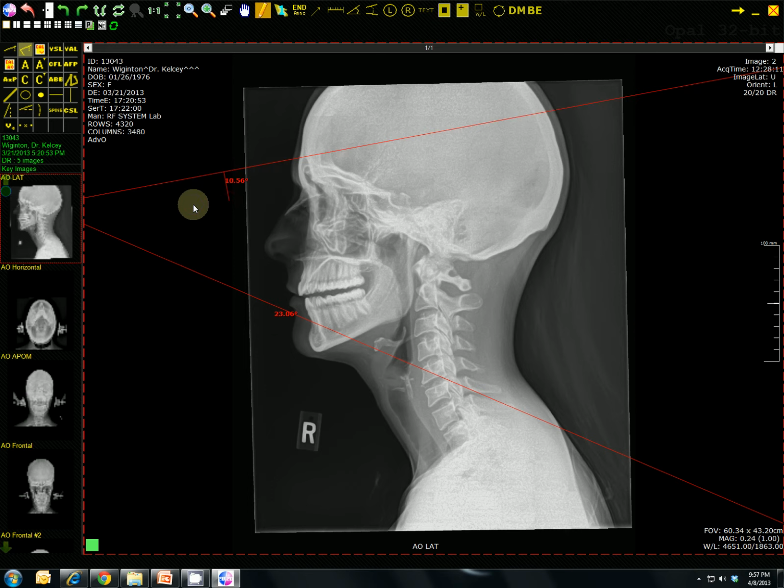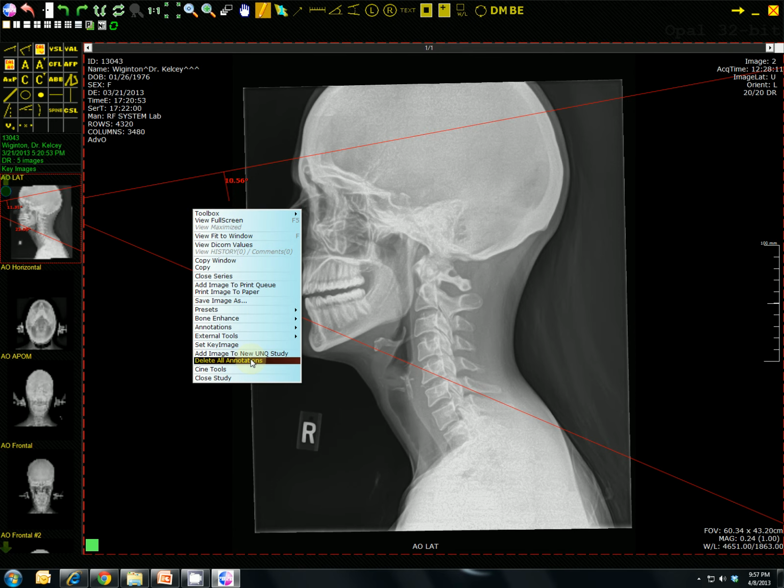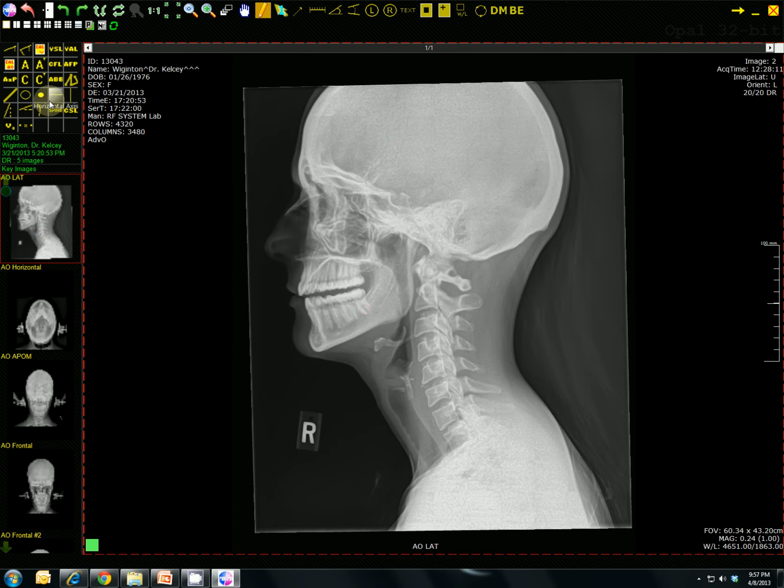Okay, go ahead and delete those. The ones I wanted to show you was the vertical level and the horizontal. Again, pretty simple, self-explanatory. It's just from that vertical, how far off of that angle is it, and however many millimeters. Same thing with the horizontal, it's the same difference.